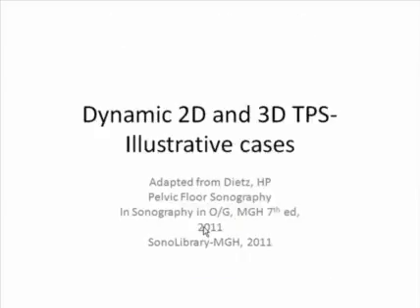Now, the best way to show this, I think, is in cine format, and I would recommend that you refer to Dr. Dietz's work. I am fortunate in having this on the website for my big book, and you can go to www.sonobook7e.com and see these images.